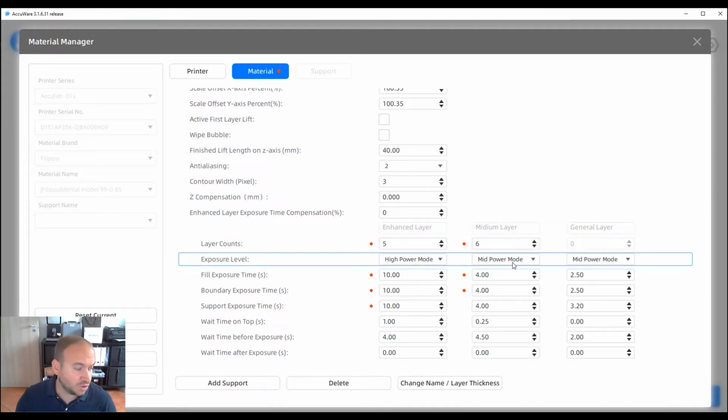Very important suggestion: every time you try a new resin, but also every time you print with the Shiny 3D printer, we strongly recommend creating the model base, the base where the supports will be connected, for 2 reasons. The first reason is that when you go in with your tool to remove what you have printed, the object will not be damaged, because sometimes it's necessary to use strong force to remove the printed object in contact with the platform. For that reason, we always recommend creating the base where the supports will be connected.